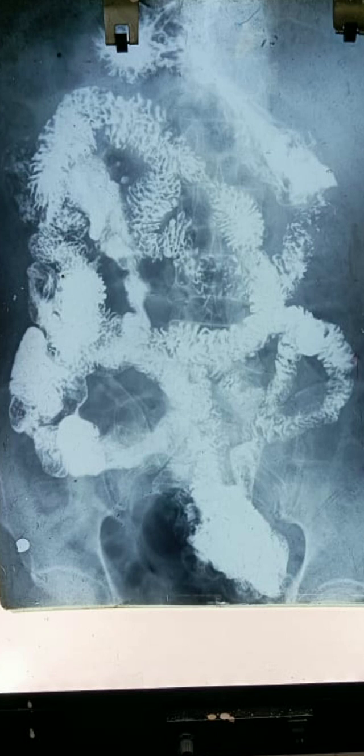So here we are following the barium sulfate liquid from the esophagus into the stomach and then into the small intestine. Therefore the name barium follow through. We do this kind of radiograph whenever we suspect any ulceration, scarring, stricture, stenosis, narrowing, abnormal growth like polyp or carcinoma within the small intestine, which shows luminal defect. It's also called a filling defect. So whenever you suspect a patient to have a small intestinal disease, we'll do this kind of radiograph.